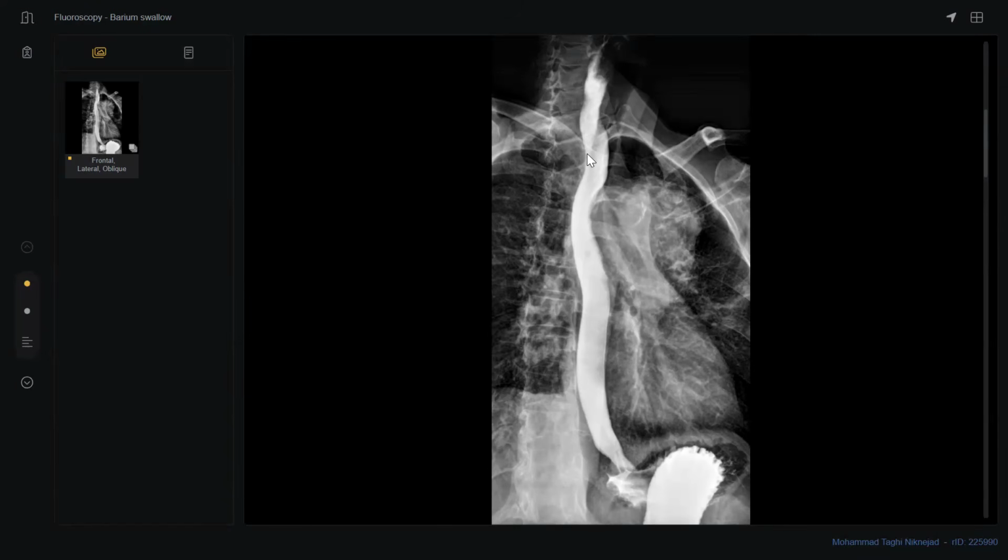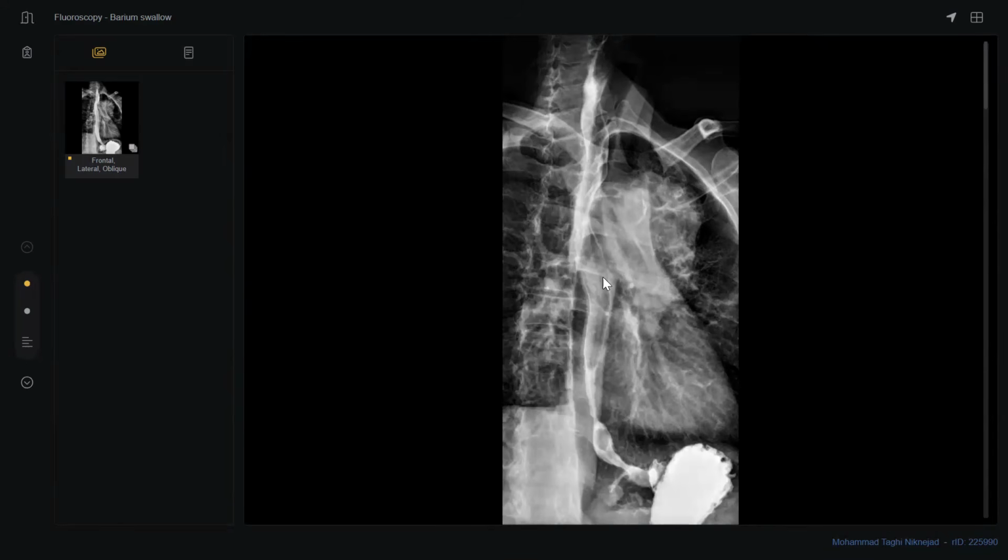In any barium study or any chest or shoulder image, we should have a look at the lung, either for pneumothorax or mass. Very clear, pneumothorax or mass. Here we find something. Start from the beginning. Consider this one like the control one, because this image contains the least concentration of barium. Okay, there is opacity here. At least tell the examiner there is opacity. Okay, my diagnosis may be lung carcinoma or infection, whatever. I want to do CT.